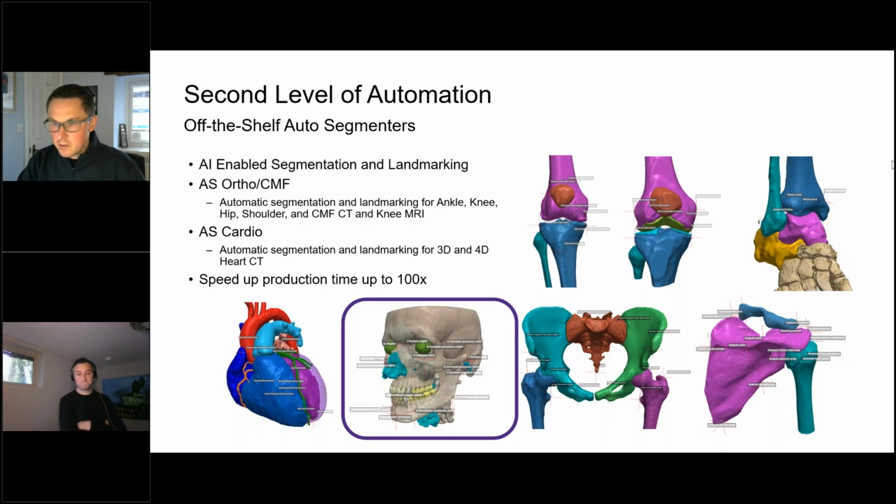Some quick questions. Can you separate the cortical bone, trabecular bone, red marrow, and yellow marrow? I guess not on the off-the-shelf tools we have here, but with custom solutions, if we can consistently segment it and it's visible within the scan, then yes, we can build a model to predict that or do the inference on those different parts of the bone.